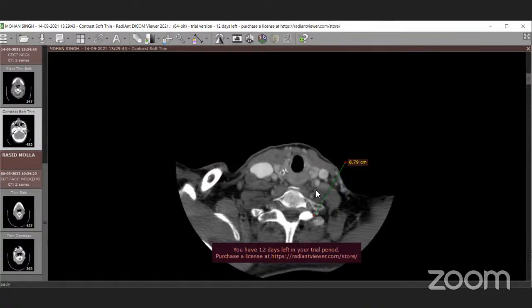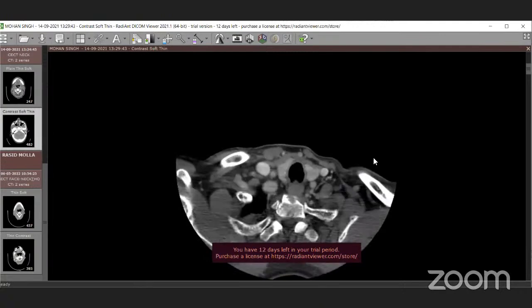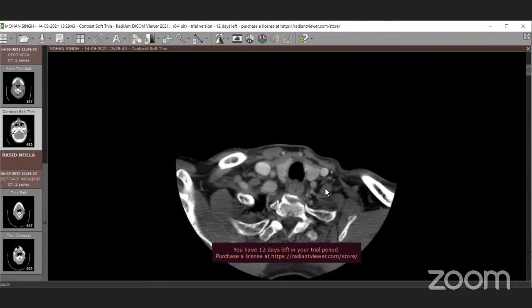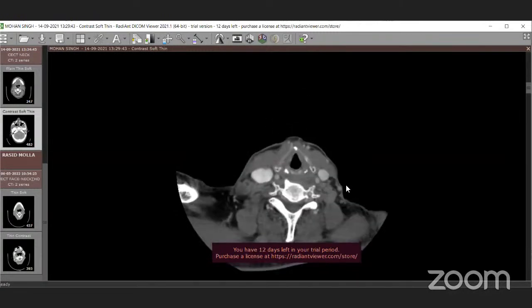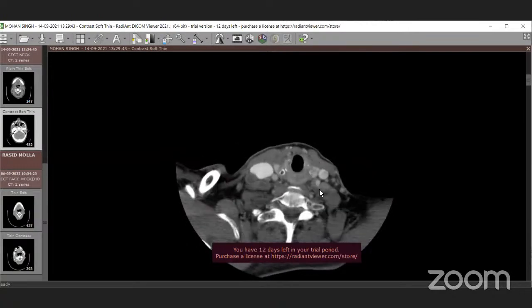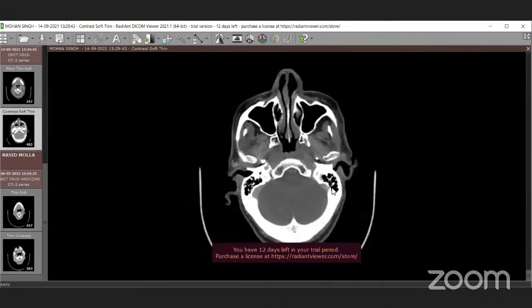This muscle here, just behind the carotid sheath, is the scalenus anterior muscle. Could you please show us its superior and inferior extent? The inferior extent is onto the first rib here, and as we trace it, this is the scalenus anterior, and it finishes onto the transverse process of the cervical vertebrae. I am just running it through again, inserting on the first rib.